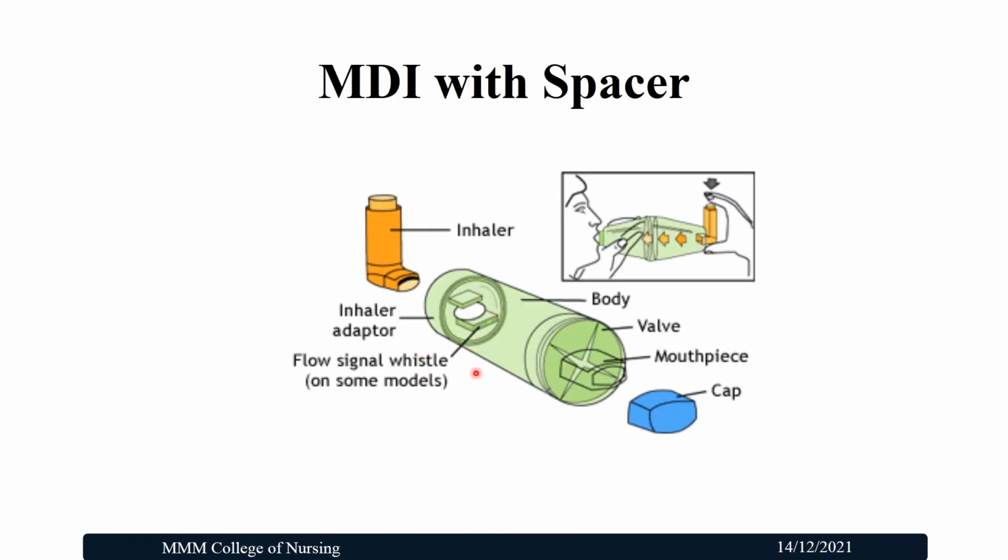Here we can see the chamber has two ends. One is the inhaler adapter end, where the MDI will be connected. The other side is the mouthpiece, through which the patient can inhale the medicine.